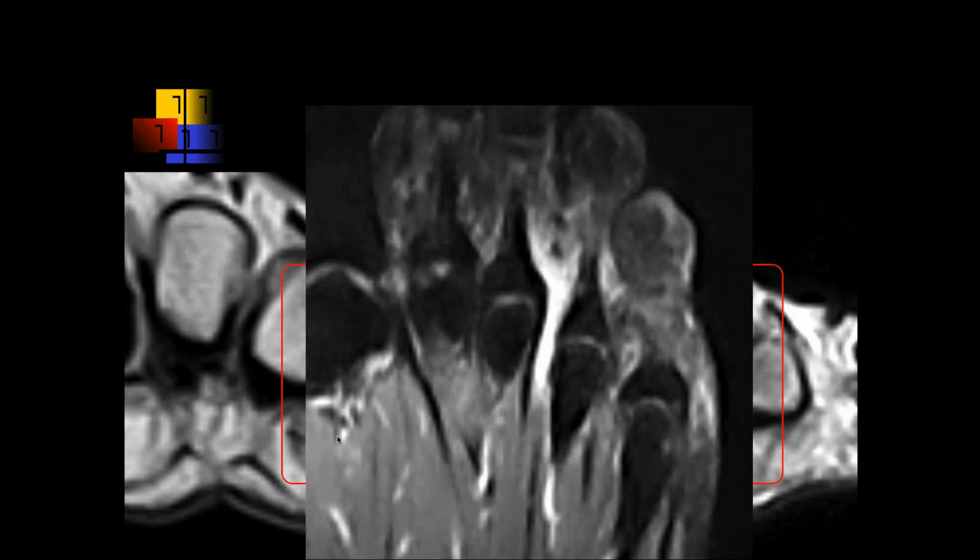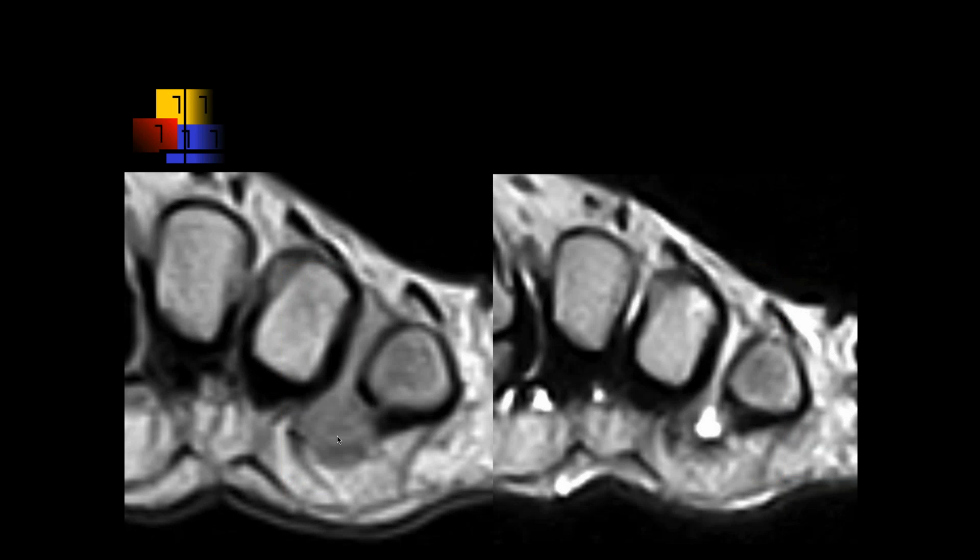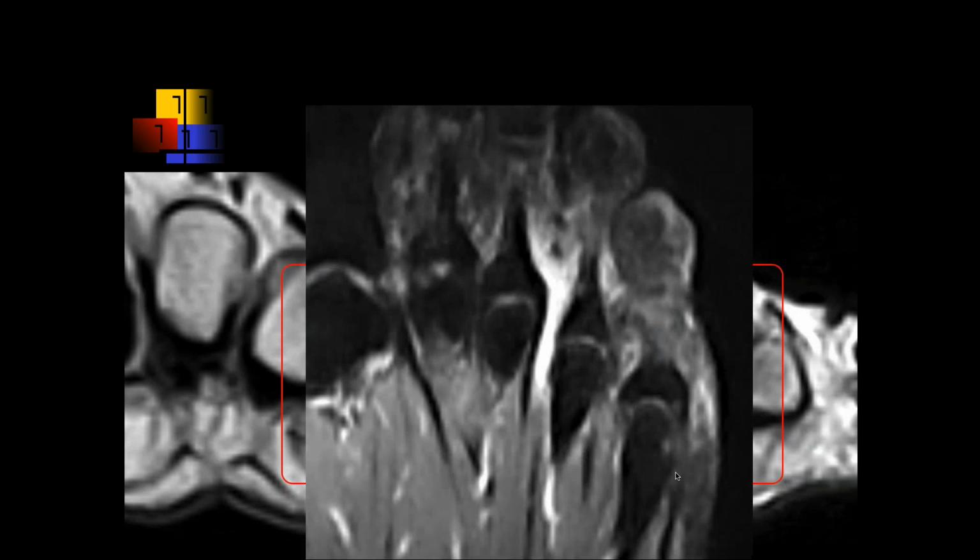Okay. So here is a PD. Actually, I think this is the first, second, third, and fourth. So this is the third and fourth. Okay, I agree with you. It looks like fourth and fifth just here, the little picky toes over there. Here are the axial images.